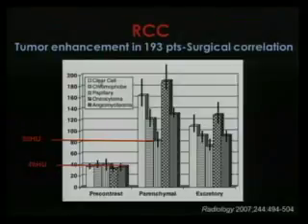This is pre-contrast. Look here, these are renal cell carcinomas, clear cell, chromophobe, and papillary, and this is the oncocytoma, the other type of tumor that can affect the kidney, and angiomyolipomas. Considering all these, we have 92% of the tumors affecting the kidneys.